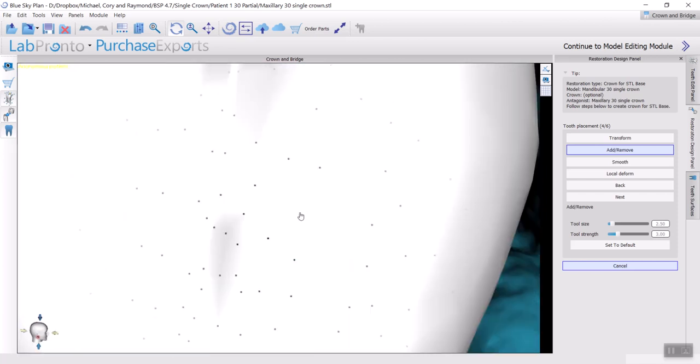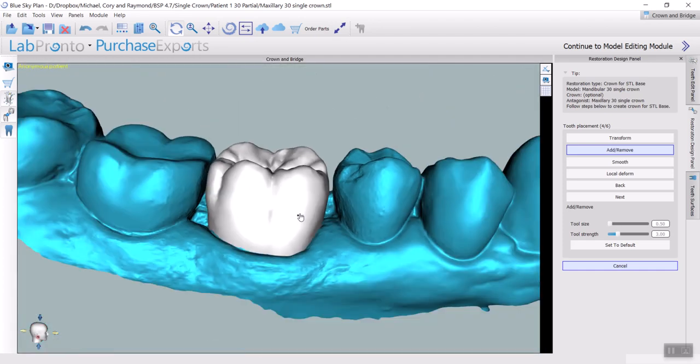Principally, as you can see, let me show you, we have a very dark area in the middle, and then it actually vanishes towards the limits of the area. That is because if I activate it, it will activate gradually, in order, towards the apex of my cursor.